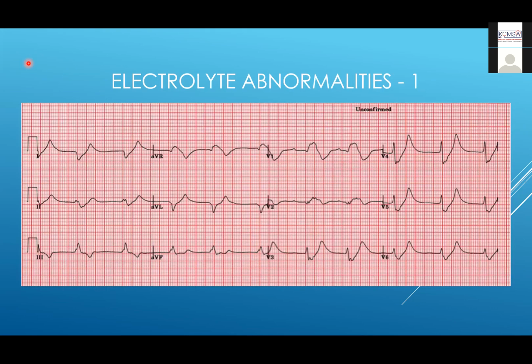I'm just going to give you a couple of slides on electrolyte abnormalities. Does anyone want to interpret this ECG? Not Ahmed. Yeah, I give up. It's okay. We're only here to learn, and it doesn't matter if you get things wrong. I still get things wrong, and I'm in the CCU.